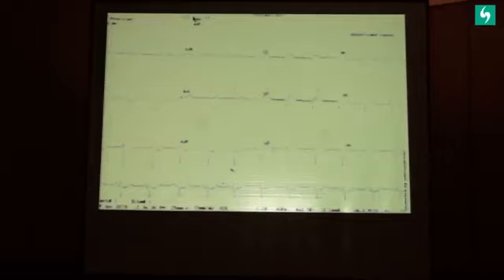So this is the ECG. You would see the 2, 3, AVF showing some ST depression, AVR, that slight ST elevation, and a peaked T wave in V2. This tells me clearly a proximal LAD and a proximal circumflex are involved, likely to be a left main disease. Immediately the patient was in the lab, and this is what the angiogram was. The proximal LAD is gone completely.